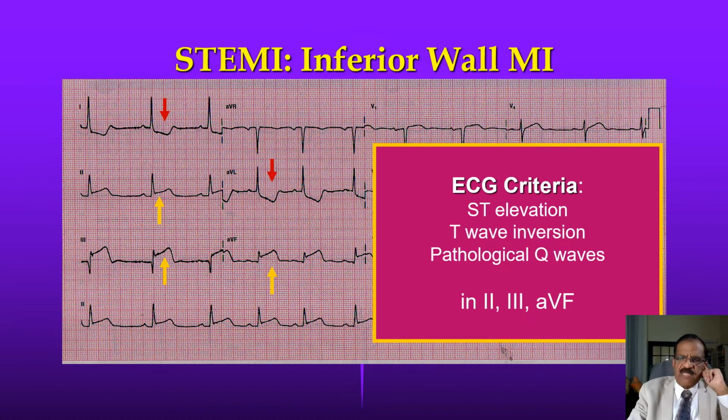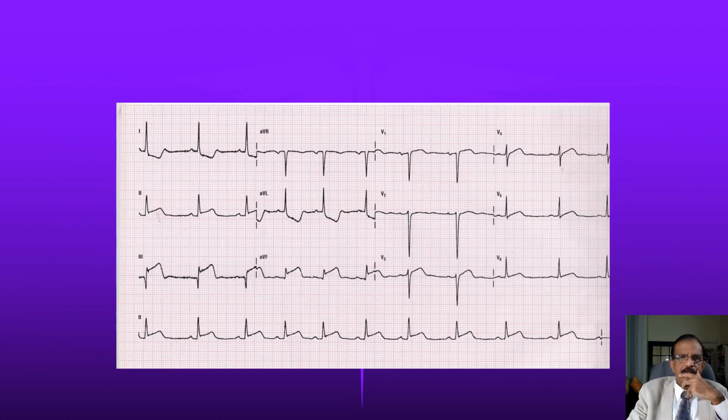Now let's take another example. How about this one? I think, what do you see here?